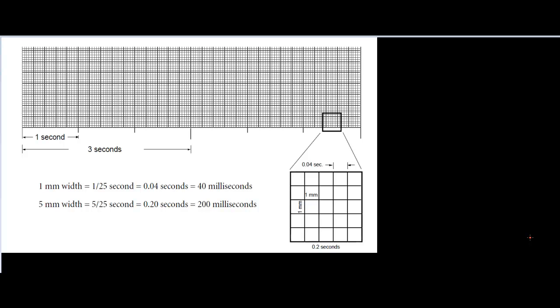Welcome back. We are very close now to reading our first EKGs. When we do this, we'll be looking at EKG paper, so I thought it would be a good idea to take a look at EKG paper and get some idea of what it is we're looking at. We have an example here in front of us.